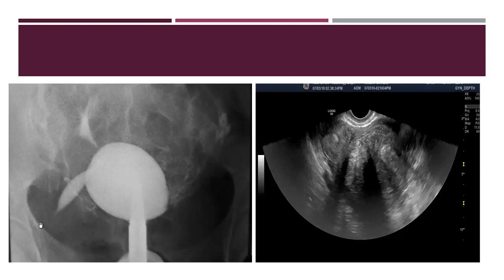Also, when you find an abnormal appearance, you have to take a lateral or oblique film. It will give you an impression of what this is. You will find that there is something compressing the uterus from the other side. So then we have a bicornuate uterus, but with a large fibroid displacing the cervix like this one.